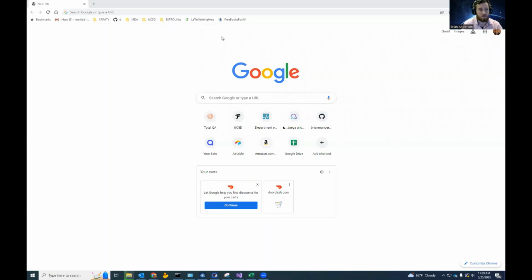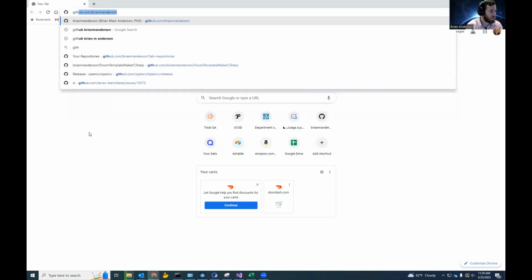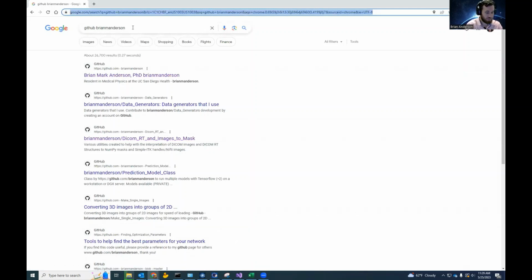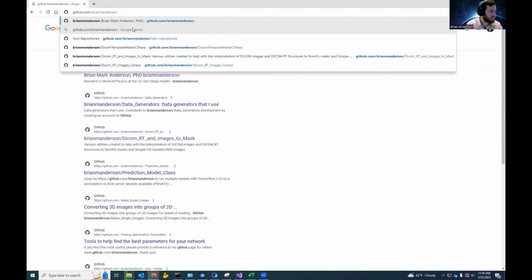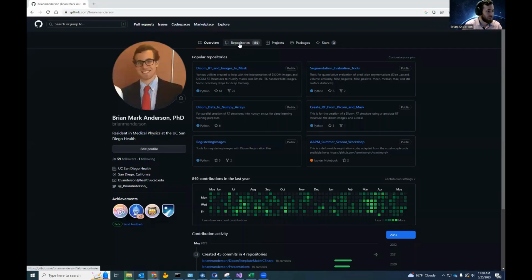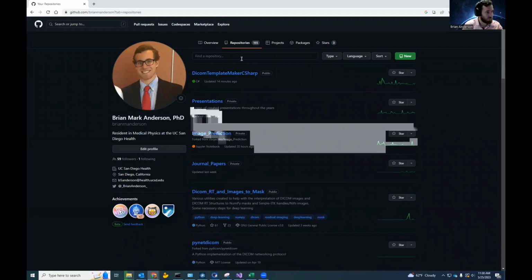All right, so in order to install the program, what you're going to do is open up a little Google browser over here, and I'm going to Google GitHub Brian M. Anderson. That should bring you to this link, although you can also simply type in github.com/Brian M. Anderson. This is going to bring you to the splash screen of my GitHub page. You can see all the repositories that me and others have collaborated on before.